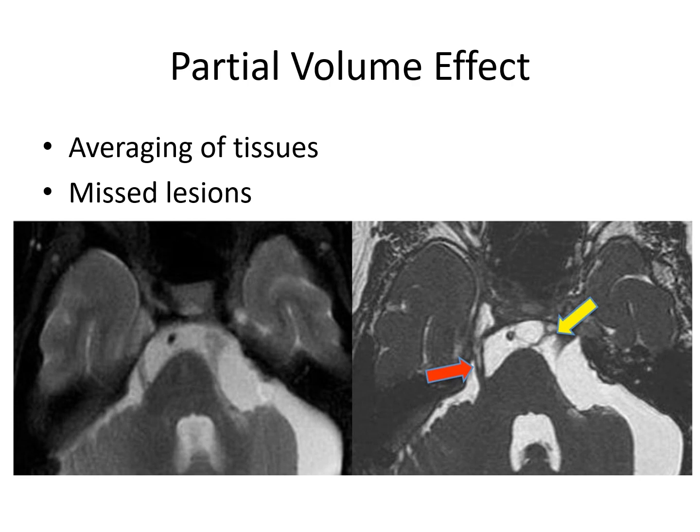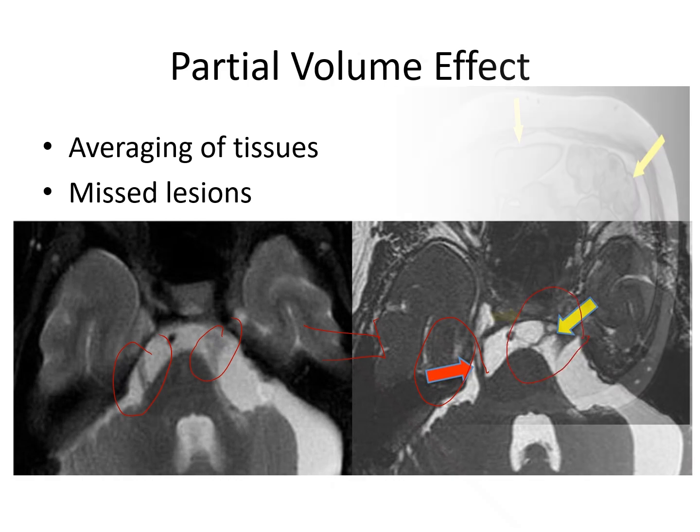In the first image there is a thick slice image showing partial volume averaging. We cannot properly see the nerves and the scar within this CP angle and CSF spaces. So this is the area and this is the area. Whereas when it is taken in 1 mm slice thickness, we can see the nerve anatomy and this is the scar within the CSF space.